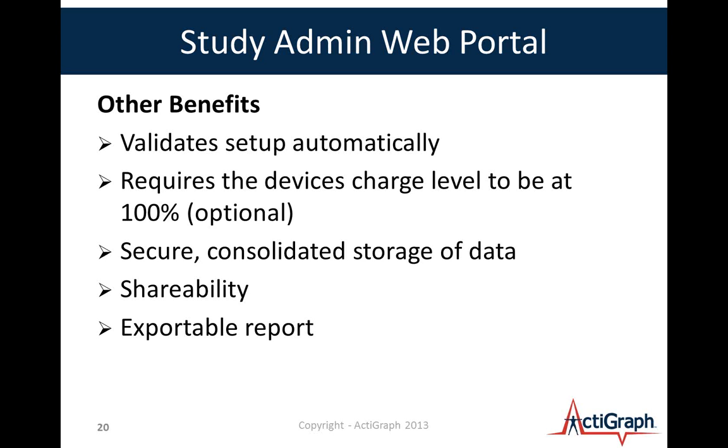If it's on the web, then I can easily share it with my colleagues. And then at the bottom there, you'll see the exportable report. In the next slide I'll talk a little bit about it, but we're working to make these reports exportable to various formats that meet the needs of some clinical teams.